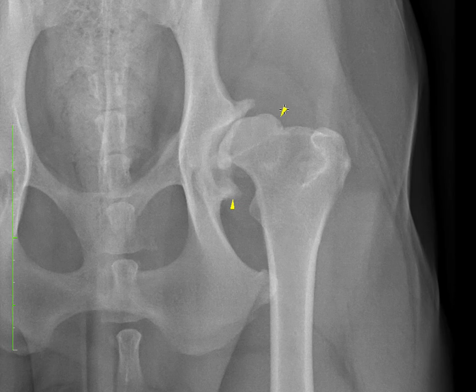The 2 main types of periarticular new bone formation that I might want to be specific about are called osteophyte and enthesiophyte. Definition of osteophyte is new bone formation at a bone cartilage junction. An example of that would be new bone formation right at the edge of the femoral head. The femoral head is the edge of the cartilage, so this is a bone cartilage junction. An example of enthesiophyte would be new bone formation at a soft tissue insertion. An example of that is shown here. This curvilinear line has been referred to as Morgan's line and has been associated with enthesiophyte at the insertion of the joint capsule on the femoral neck.